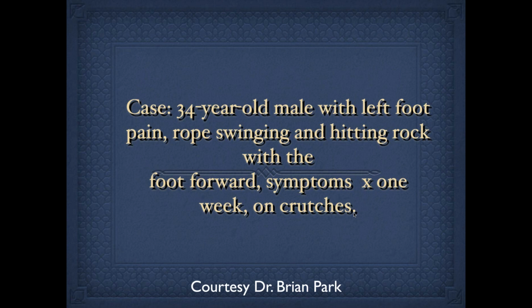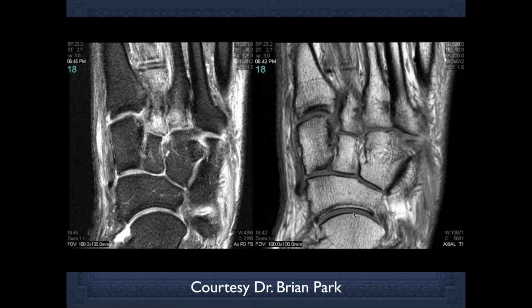Okay, Jennifer. So we have a 34-year-old with left foot pain, rope swinging, and hitting a rock with the foot forward. Symptoms for 1 week. Here we have some edema in the second metatarsal base and third metatarsal base. It's near the attachment of the Lisfranc ligament, so I'd be concerned about an injury of the Lisfranc ligament.